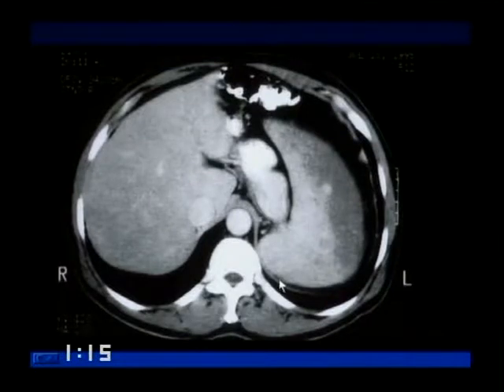There are two other interesting patterns with splenic infarction that are much less common. One is this, where I've seen a more geographic, unusual pattern. And for those of you, I don't know if we had it in the lectures this morning on liver, but in discussing diffuse liver disease, one of the patterns of infarction are also something like this. It could be very unusual, peribiliary or geographic. I'm not sure of the pathophysiology of this, but it's definitely been documented. So this is a less common pattern of infarction.